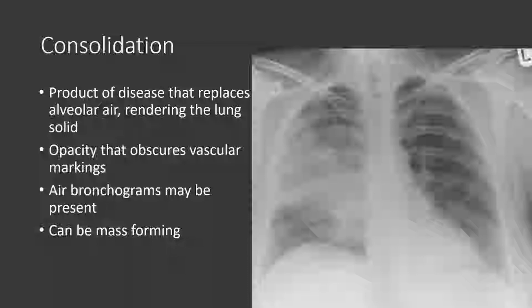Here on the right, we can see abnormal opacity in the right lung, representing consolidation shaded in green. Also note the streaky lucencies representing air bronchograms running through the area of consolidation. These represent air-filled bronchi running through lung that has been rendered solid. This tells the reader that the abnormality is located within the lung parenchyma.